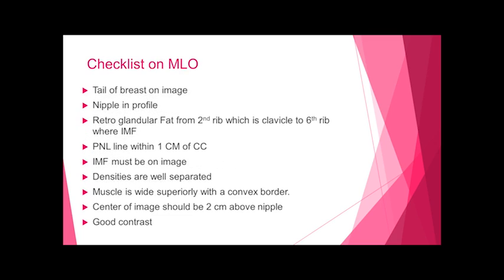Your checklist on your MLO view, you want to make sure the tail of the breast is on the image, that you don't position the breast too high on the image.